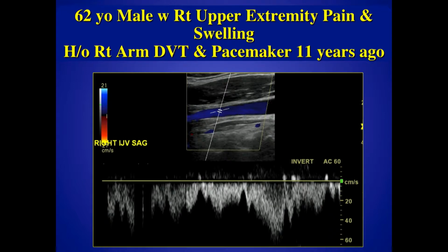we do a lot of venous studies, as you might imagine, and a fair number of upper extremity studies. But there's a big difference between flow in the lower extremity and the upper extremity, right? When you think about lower extremity femoral flow, it's relatively phasic in one direction, right? Like waves on an ocean, right? You see changes in velocity over time.